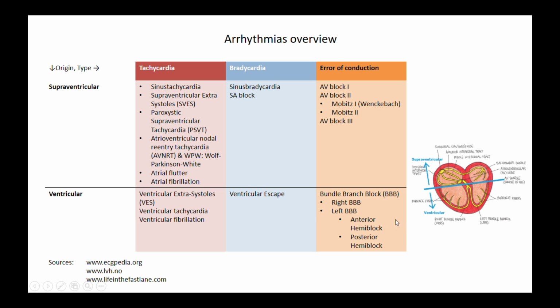And in this overview, I've tried to encompass most of the arrhythmias. Of course, there are some things that might not be covered, but if you're comfortable with recognizing all the arrhythmias we're going to be discussing today, you'll have a very solid foundation understanding of cardiac arrhythmias and how to see them on the ECG strip.